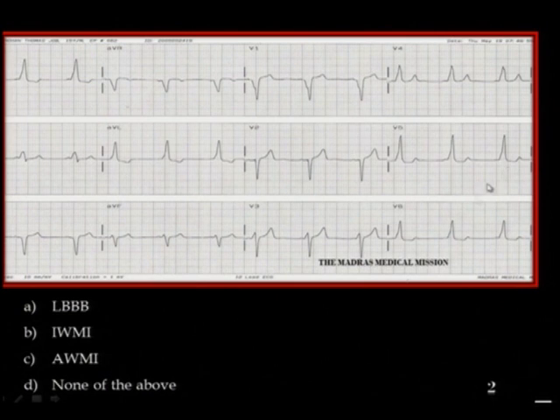and some people have read it wrongly because there's a wider QRS in the lateral precordial leads, thinking it's a left bundle branch block. But what is important is there is hardly any PR segment. Look at this V3, and the takeoff is not sharp. So this short PR with broad QRS is typical of a right free wall accessory pathway. More often than not, they may remain asymptomatic.